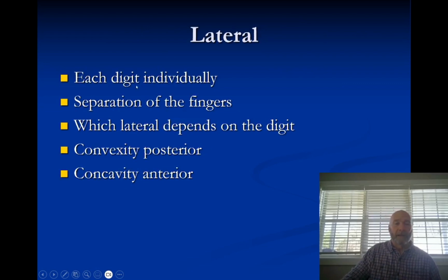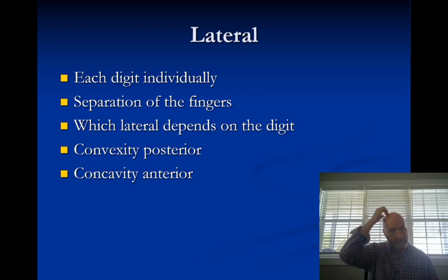So with your lateral, you're going to do each individual digit for the most part, and you still need separation of the fingers. So now it's going to be even more important that you separate the fingers so that you can individually evaluate. Some of your fingers, though, in positioning is just a helpful tip that I picked up from a student one year, and she was a first semester student very early in the program, and I don't really think that she consciously meant to do this.